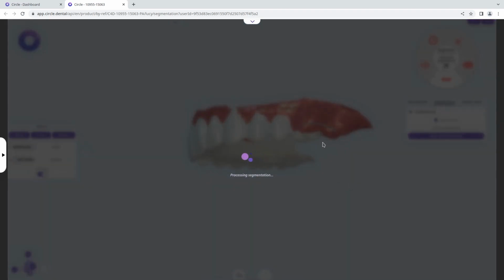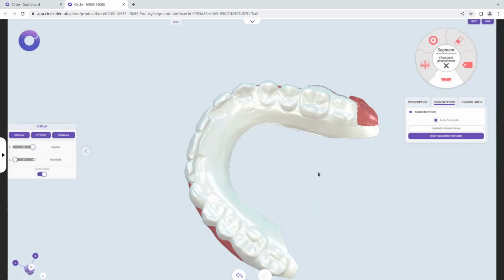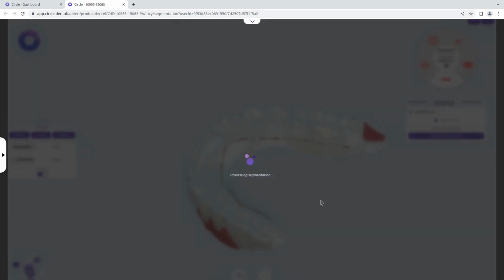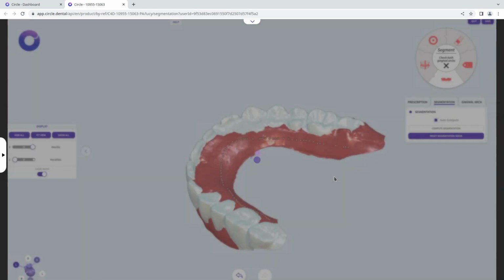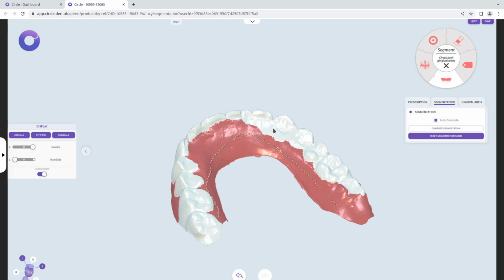So I just pressed left click, and that will automatically select the teeth in white. Here, gingiva should be here, and I place it everywhere by pressing Shift and left click. Again, that gives you a better approximation of the gingiva.